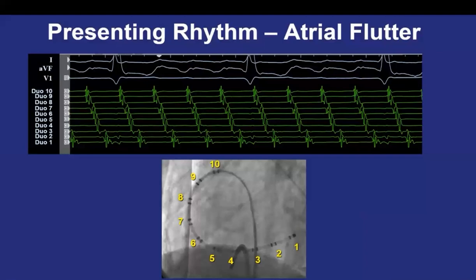Clockwise? Sorry, counterclockwise, because the first activation is in the high right atrium, then the lateral wall, going this way, and then down.